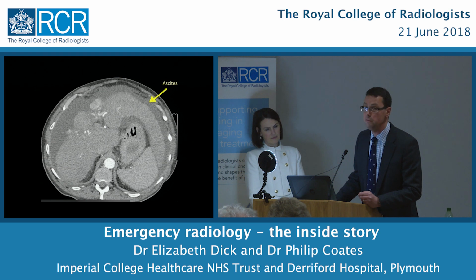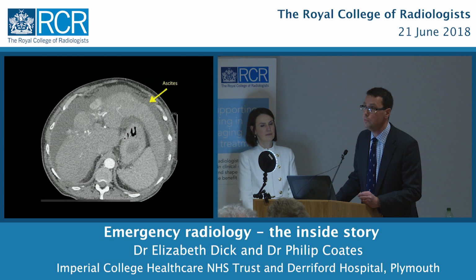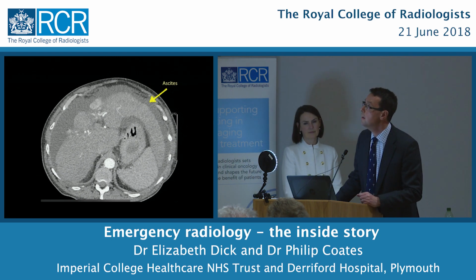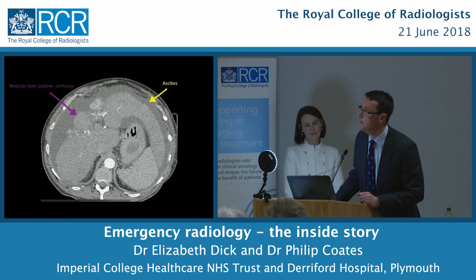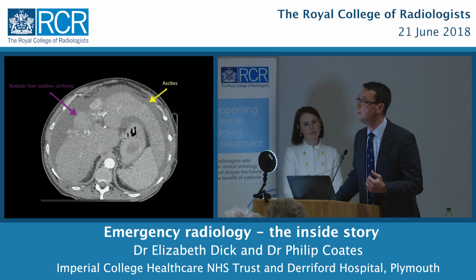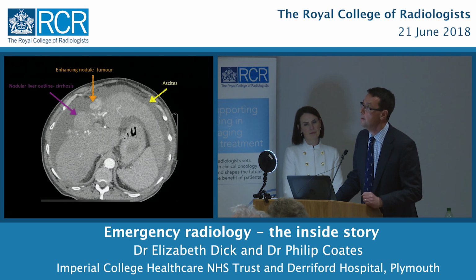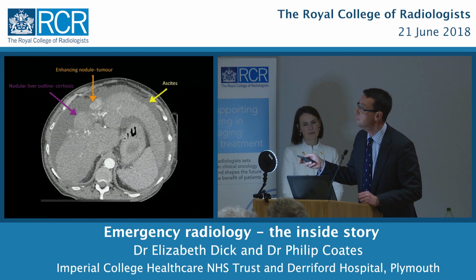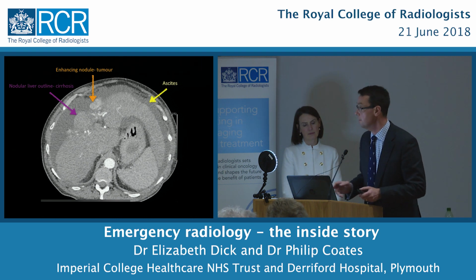there are signs of chronic liver disease here. That grey stuff there is ascites, is fluid, which again is something we see with cirrhosis and portal hypertension. The liver has a nodular outline, so that's the liver in the centre there. It's not smooth, it's quite irregular. And that bright bit there that's enhancing a little more than the surrounding liver tissue, that is liver, but there may well be a liver tumour developing there as well.